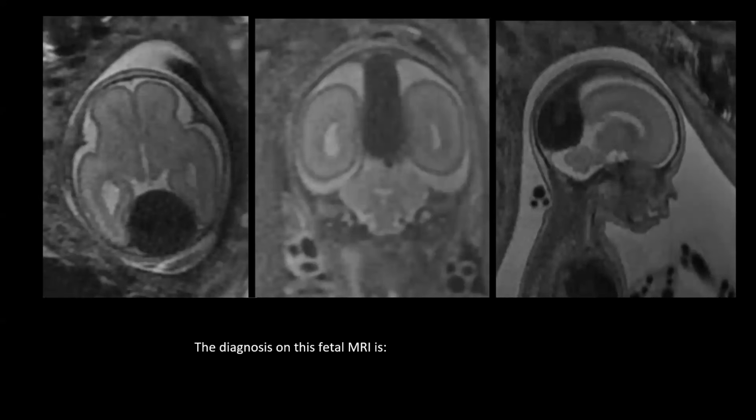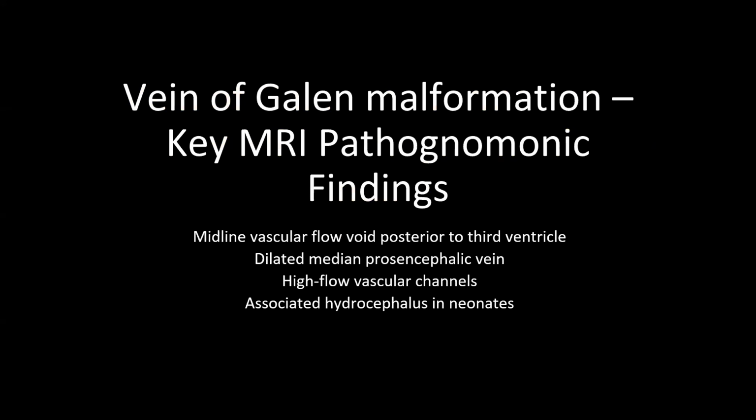Next is a case on your screen, which is a fetal MR. So this is a fetus which has been scanned using MR, and what you are seeing is a large flow void. So abnormal flow void, which is seen here in this fetus. So this is vein of Galen malformation in a fetus. Okay, so midline vascular flow void, dilated median prosencephalic vein, high flow vascular channel. MR will not tell you the flow, but you can do an ultrasound with Doppler as a screening, and look for associated hydrocephalus in neonates. So this is how you can see malformations in fetal MR.